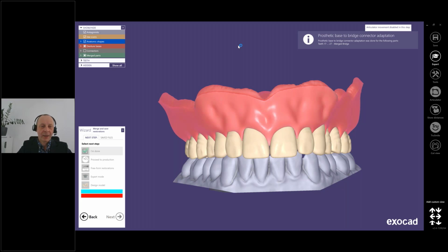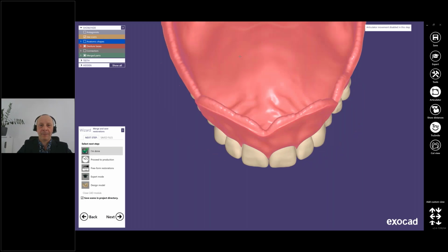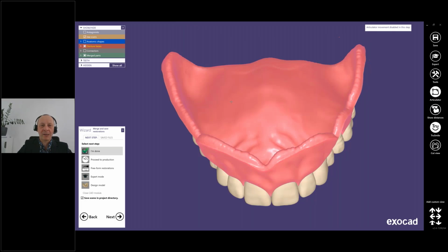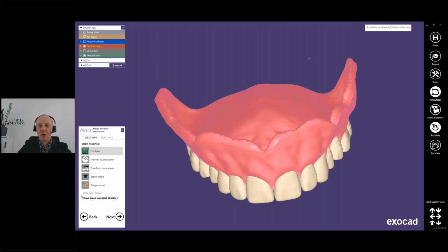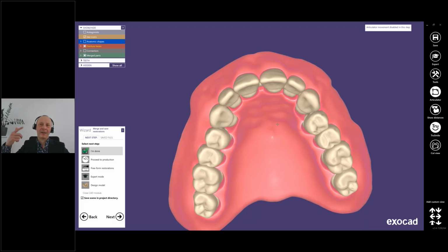There are different approaches. Basal trim of teeth is supposed to work with carded teeth, with real teeth. Then the base has gaps, just pockets through the base, and you mill the base from the occlusal side, and during the milling you create these pockets, probably with gaps because the teeth are longer than the base.